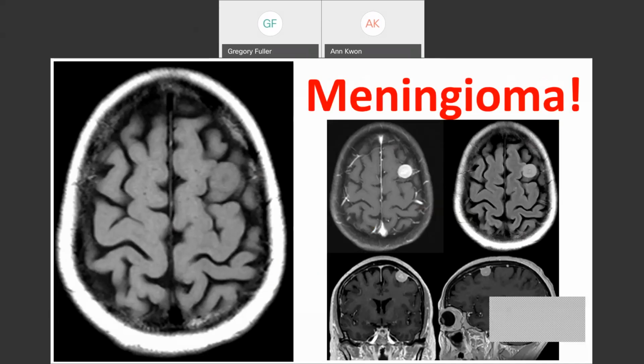All right, it's the same meningioma I showed you, only I didn't show you the T1 without contrast. All right. See, that would have been a little more challenging if I had not already shown you the case, right? But now the point of it, I showed a different case, but similar to this last week, 2 weeks ago, I can't remember, and that was a very difficult challenge. This one's a little bit easier, but you're looking for similar alterations. So kudos to everyone who got this right.